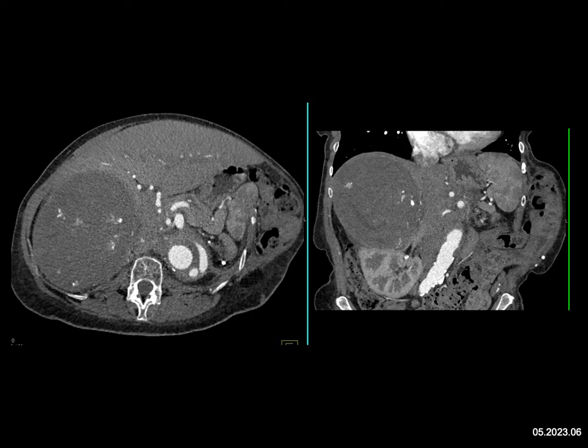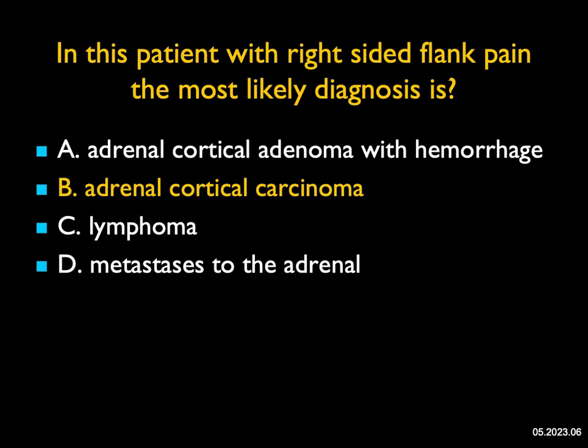You'll notice I did not comment on possibility of A. And although my best bet, you should say this is a carcinoma, this was resected and was an adenoma which bled. I've showed you some adenomas that are large, that are atypical. Adenomas, it's amazing when they bleed, particularly if bleeding was a long time ago. They have unusual appearances, including calcification. They can be very large, and it can be an incredibly difficult diagnosis from a radiology perspective.